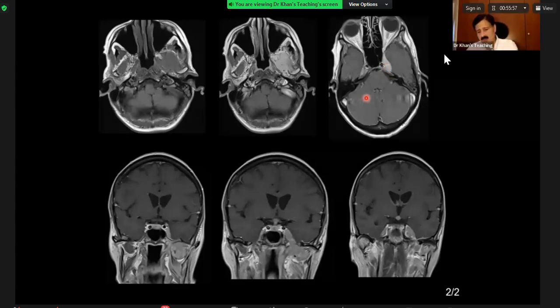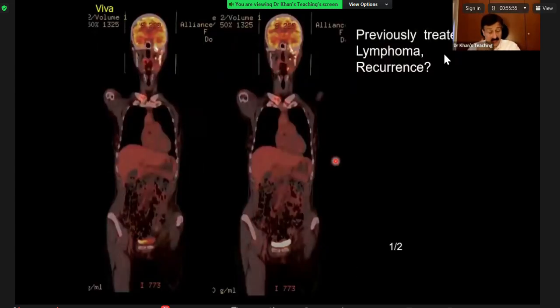Okay, let me take over. Now, if you see here what has happened, this is a very important case for head and neck world. I'll show you the next case and then you will see the anatomy. Basically, please remember that from the Meckel's cave, the V3, which is the third division of the trigeminal nerve, goes through the foramen ovale and it goes into the masticator space.